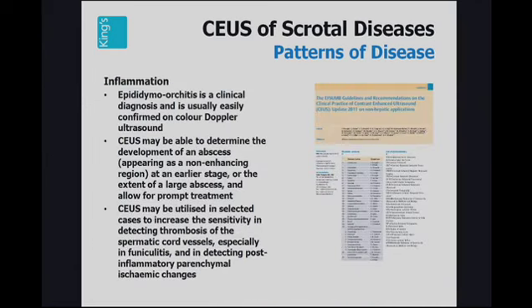Let's move on now to inflammation. Epididymo-orchitis is usually a clinical diagnosis and is usually easily confirmed on colour Doppler ultrasound. The addition of contrast-enhanced ultrasound will allow you to determine whether or not an abscess is appearing. This is a non-vascularized area and will not enhance.